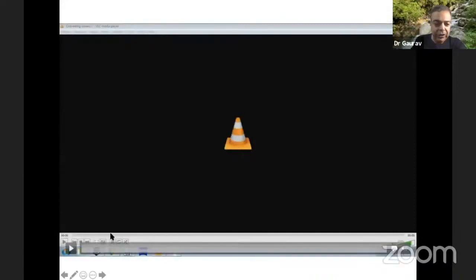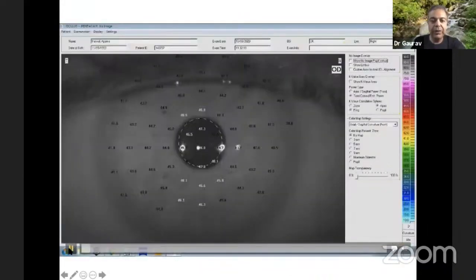So I made a short video clip to show you how. I measure it in two ways, and Himanshu showed a beautiful way, which I do as well. And then I also use the iris image option. From this drop menu here, you can choose the iris image. Now, typically the iris image will show you many things, and you have to switch off a few of them.